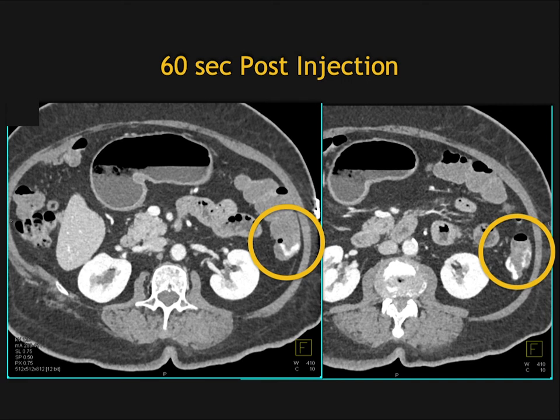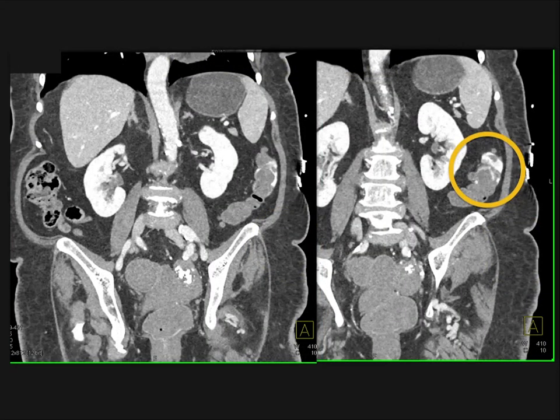And so it's a really good way of thinking about how to optimize your detection, arterial and venous. And the venous also will predict what patients need to have intervention and which patients can be managed conservatively. That is indeed important. And here's the coronal view showing you that active bleed. And you can see it's much more impressive than on the original studies.